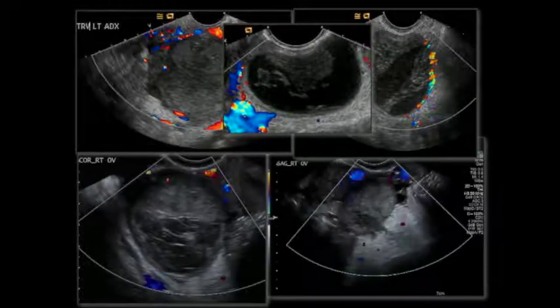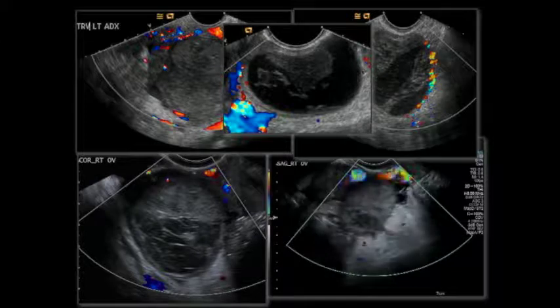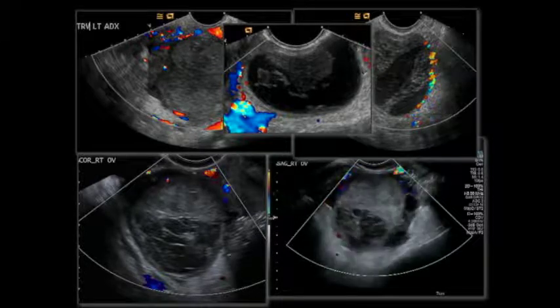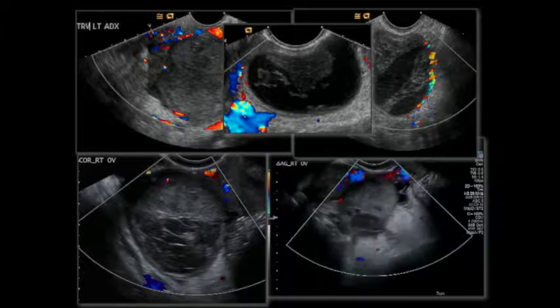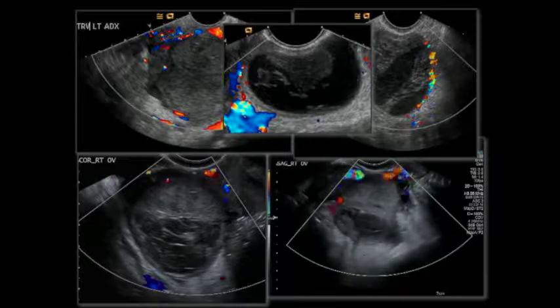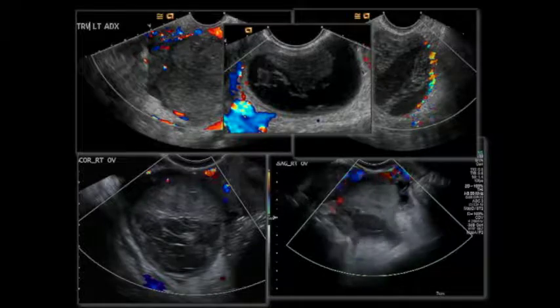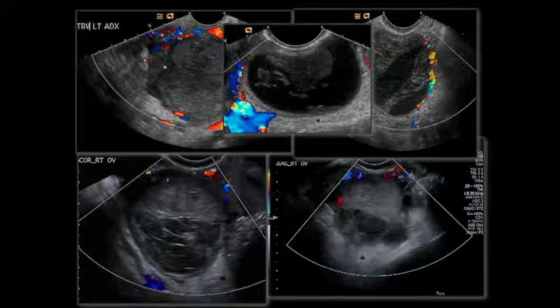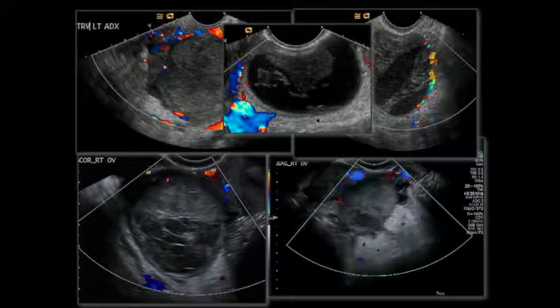In the next case here, there was both this hyperacute and a little bit older blood noted within this hemorrhagic cyst. And if you're not familiar with this appearance, unfortunately, this was misinterpreted as a dermoid, with the more echoic part being possibly the fatty component, and these fibrinous bands representing the dot-dash pattern. And then it was thought, well, it's so big and there's acute pain, perhaps this represents torsion, and it was misinterpreted as an ovarian torsion, which does happen.